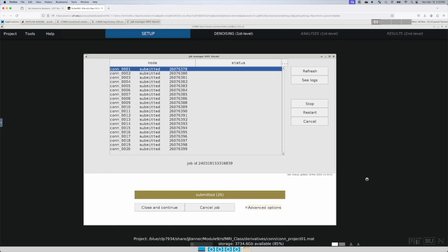But if you're doing this for a real thing, you could go and add in data in the setup for the project, add new participants, add them at the end, and do all of that. Sometimes I just start over and reprocess everything. It can be a little bit simpler. It just depends on where you are, how far you are, how much you have to add, or whatever the case may be. But you can add participants.